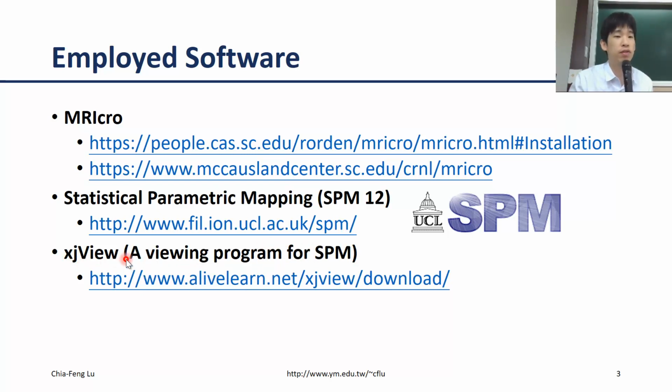It's actually a pretty convenient package that can show the 3D brain mapping or the slice view mapping or something. We will show you at the very end of this class. So please do download this package, and I will show you how to include the paths in the MATLAB environment again, so you can use it after you finish the process.